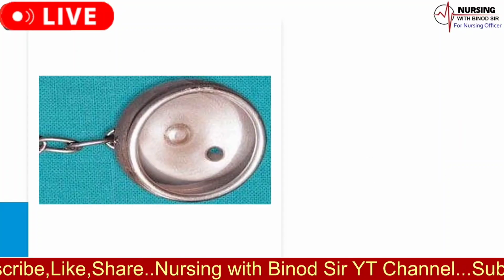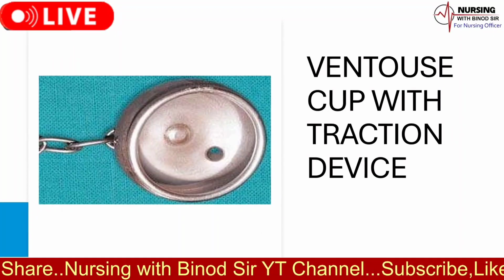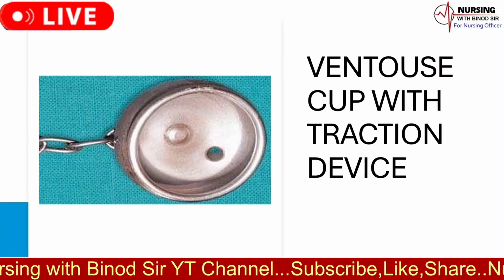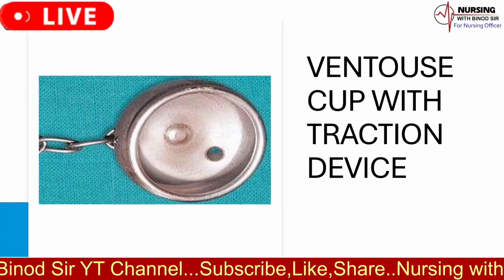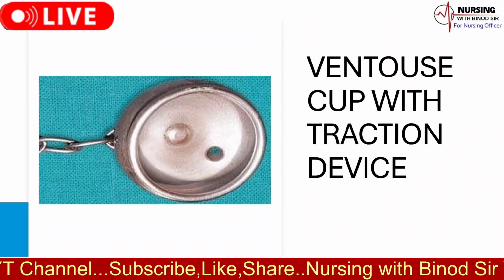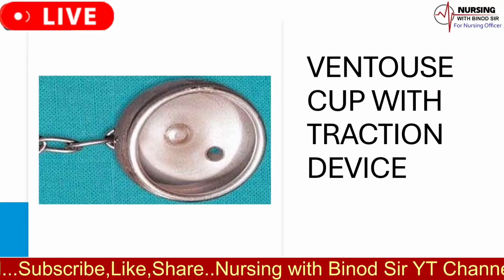The name of the instrument is ventouse cup with traction device. The uses of ventouse cup with traction device is as follows. 1. Assisted vaginal delivery. The ventouse cup is used to aid in the vaginal delivery of babies, especially when mothers face difficulty in pushing the baby out.